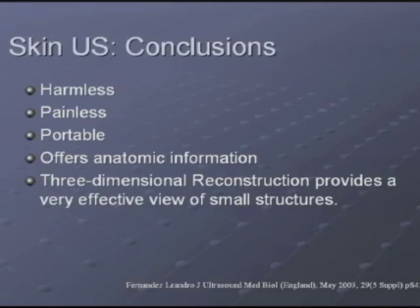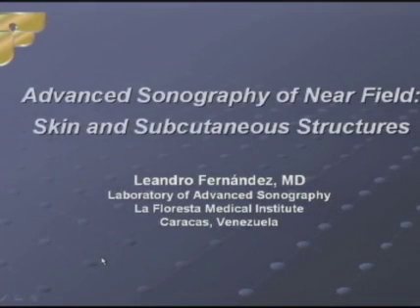So in conclusion, skin ultrasound, near-field ultrasound, is a harmless, painless study that can be done with a portable system if we have the transducer with the proper frequency. This study offers anatomic information, and three-dimensional reconstruction provides a very effective view of these small structures as we demonstrated here in our previous images. Advanced sonography of near field, skin and subcutaneous structures.